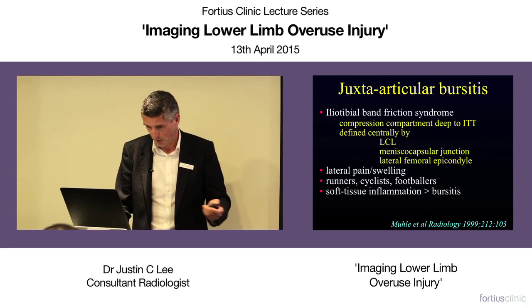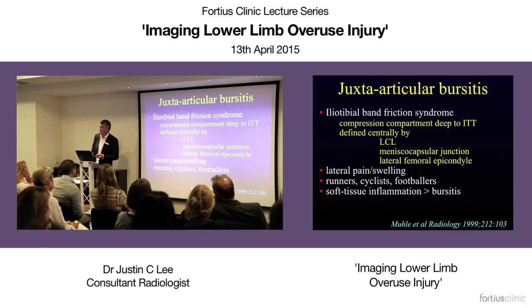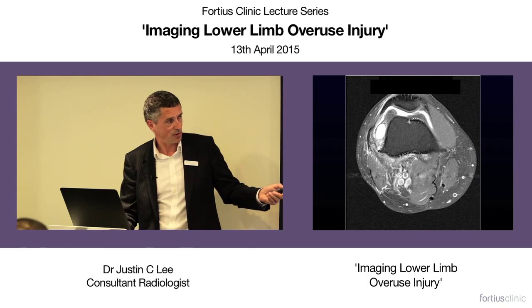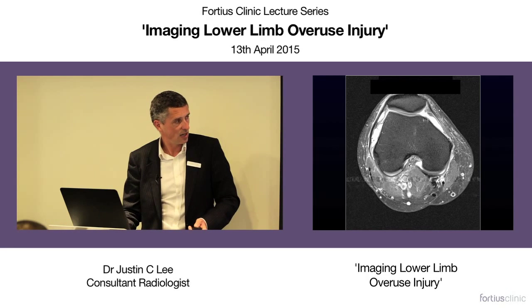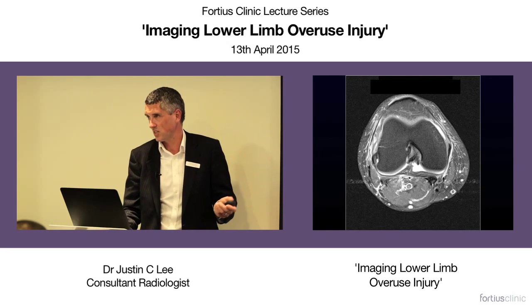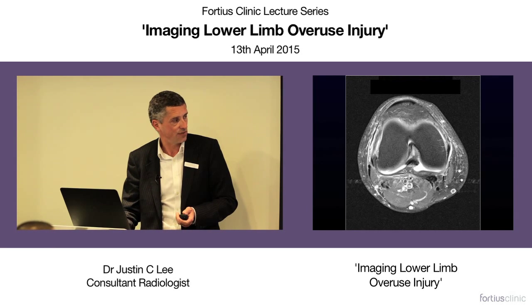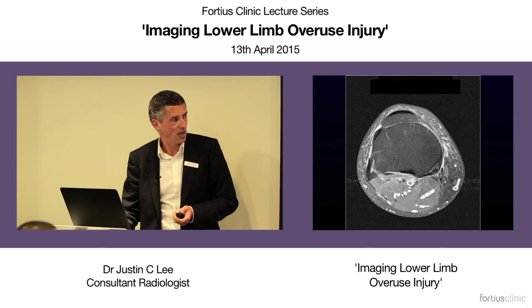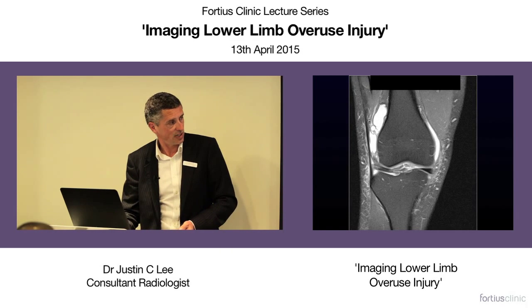So, as I said, often limited posteriorly by the LCL, and it's a classic presentation. Now, what is not so common is the development of a bursa. Now, this is about as bad a bursitis as you will see. You do occasionally see this. Probably, I don't know, 1 or 2% of iliotibial band, you get that much fluid between the two, more often than not. So this is, again, a massively impressive iliotibial band bursa.